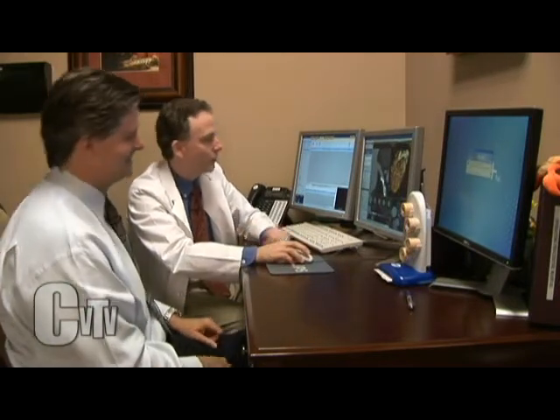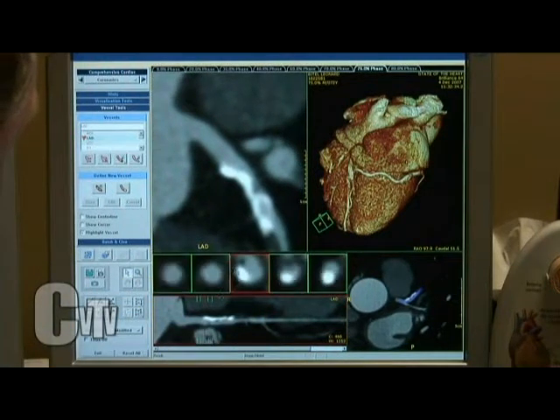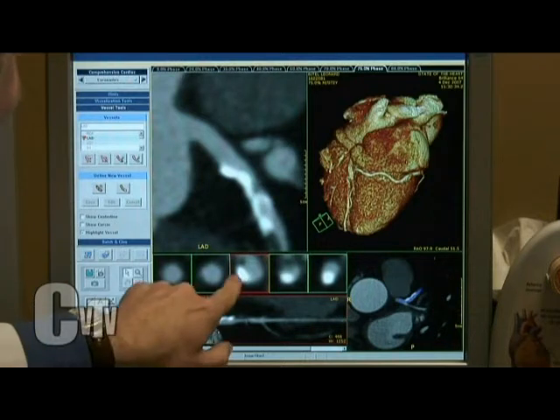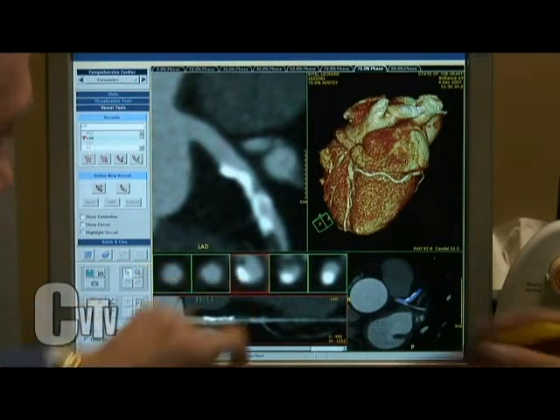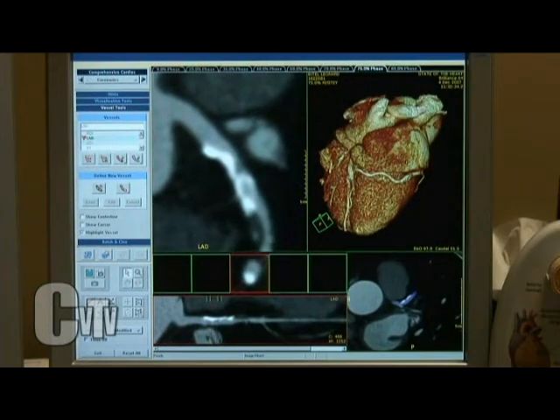Yeah, got it. So here, this is the cross-section, and you can see now we're beginning to hit plaque. And note that the plaque is out here in the wall. So is this dark spot right here early plaque? Yep. And the white stuff is old plaque? A mixture of some plaque.